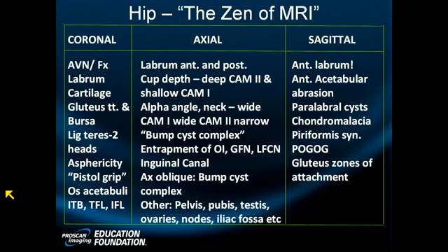Let's look at another. Super challenging. Number 92092. And by the way, that chondral abrasion was visible at surgery. Super tough case. Groin pain for 7 months, exacerbated by activity. There's no history of trauma. Patient is 17.